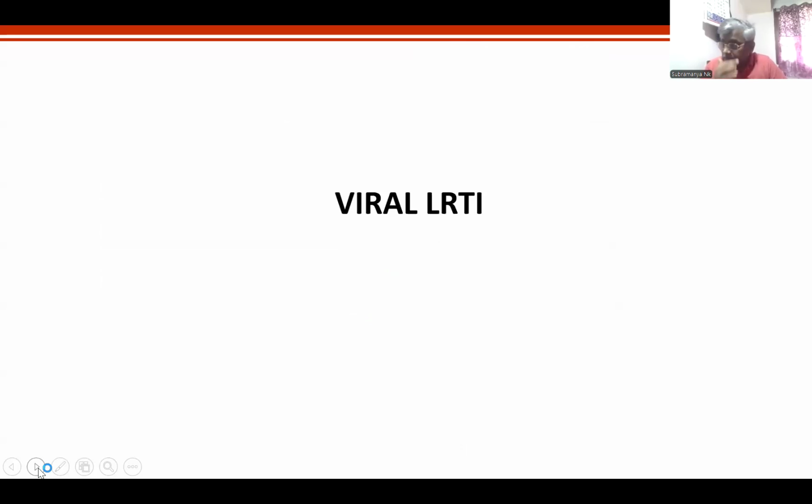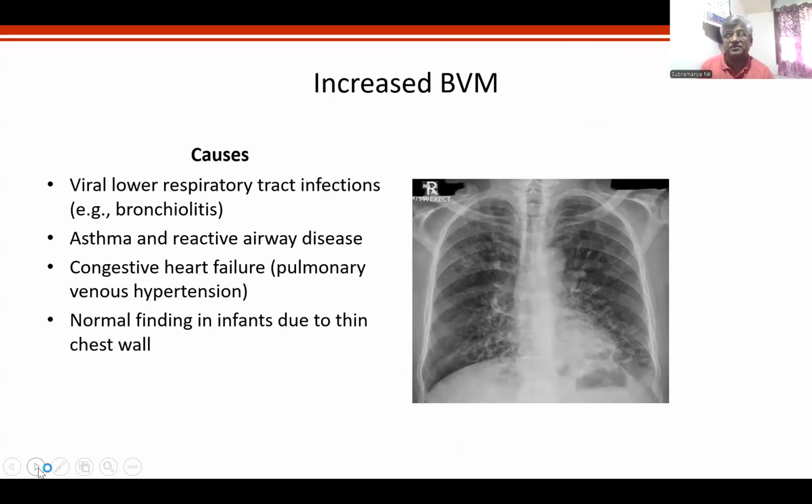I'll quickly run through in the next 5 or 10 minutes about the lesions that we see. I'll rush through them because for want of time, you have been listening to me for such a long time. And therefore, these are applications of viral lower respiratory tract infection. Viral lower respiratory tract infection is caused by many organisms.